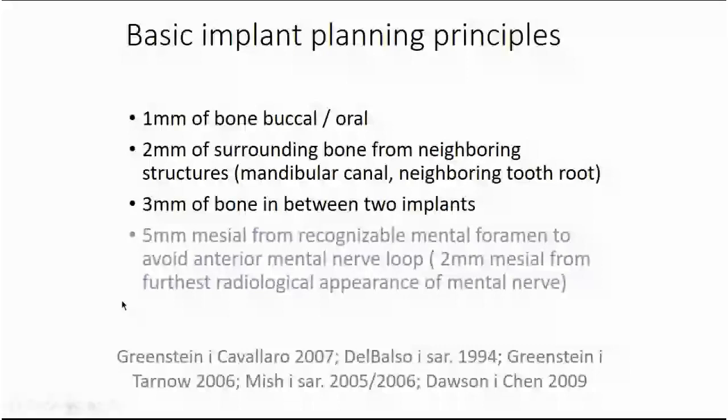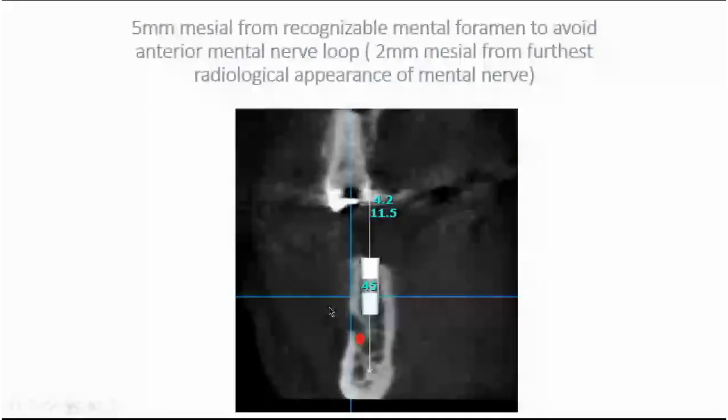Also, point number 4: due to the development of these nerve markings and to the confidence we can gain with CBCT volumes, even in the strict region of the mental foramen, we are able to be confident when we are using available bone in this region, and to use the maximal capacity of available bone, because we have a really accurate diagnosis, and it will show us the accurate position.